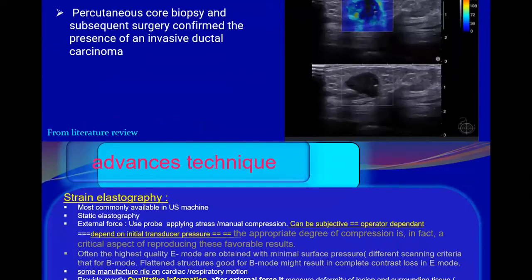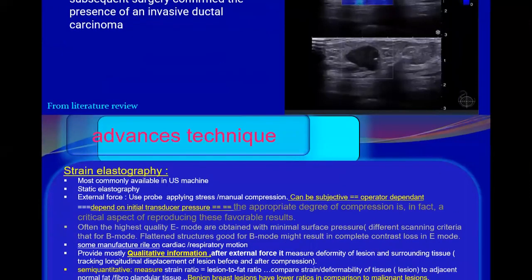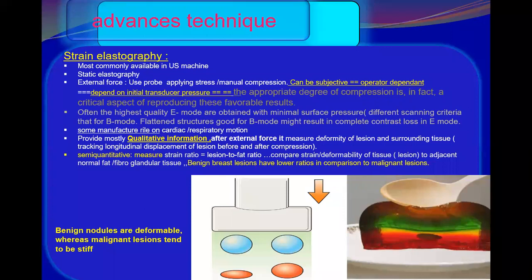And regarding elastography, the commonest technique used is strain or static elastography, and the other one is shear wave elastography. The strain elastography uses external force.